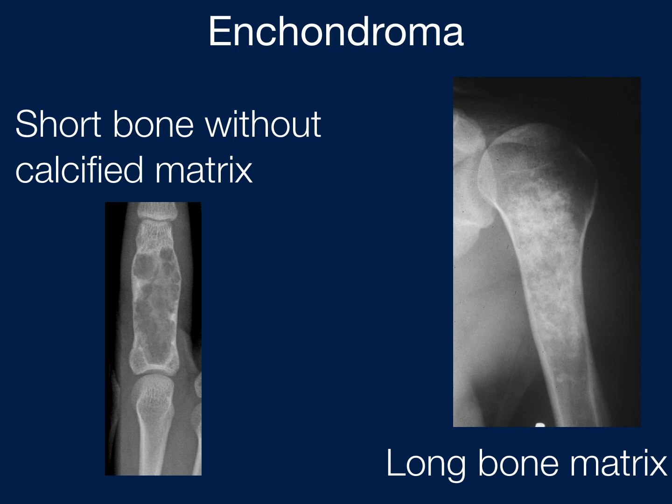These will also be in long bones, where they're often seen on chest radiographs incidentally. When seen in the long bones, it can be difficult to tell the difference between an enchondroma and a low-grade chondrosarcoma. Things to consider are the larger size, cortical breakthrough, and pain, findings that suggest a chondrosarcoma instead of an enchondroma.